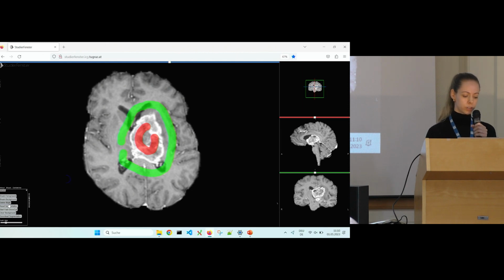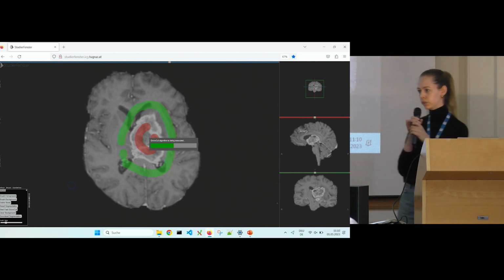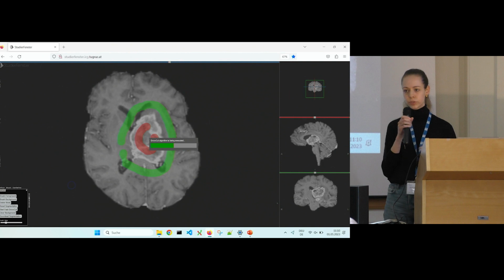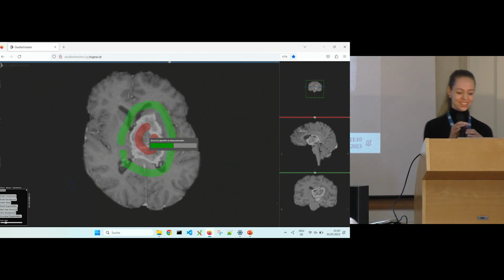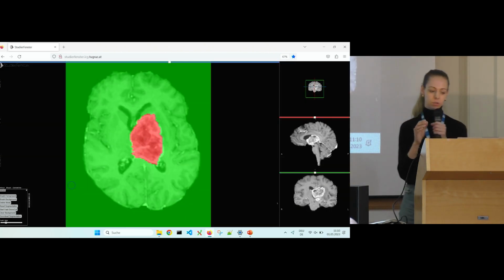Here with this brush, we could delete stuff if we want to. And as you saw, you can also reset the segmentation. If we're happy with the input, I will start the GrowCut now. So I'll click on Start Fast GrowCut. And we're now waiting for the segmentation to finish. It's sent to the server, there it's computed, and hopefully the output is sent back soon. It shouldn't take too long, yeah. And now we see the output.